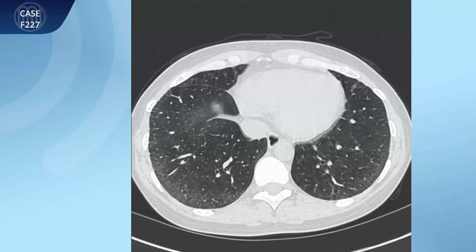I once received a report that mentioned a crazy paving pattern. It's also consistent with ILD. Okay, thank you for raising that point. Crazy paving is defined as a combination of ground glass and a superimposed reticular pattern. And this is very non-specific. Some would even call this here crazy paving. I wouldn't, but you could. In and of itself, it's not a diagnostic feature. It is seen in many diseases causing ground glass. It's also seen in a particular disease called alveolar proteinosis, but this is very rare and is not the focus of today's talk.